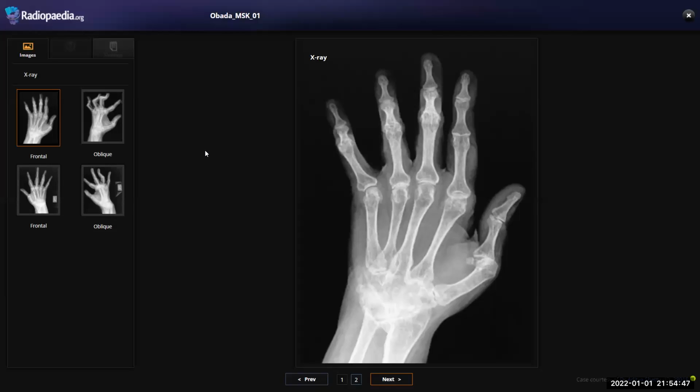This is a frontal projection radiograph of the female patient who has positive rheumatoid factor. I can see that there is a sclerosis and ankylosis involving the carpal, metacarpophalangeal, proximal interphalangeal joint with some involvement of distal interphalangeal joint also. And this is an erosive arthropathy with sclerosis.